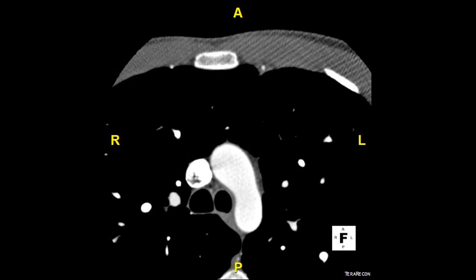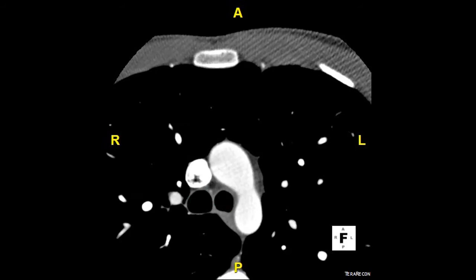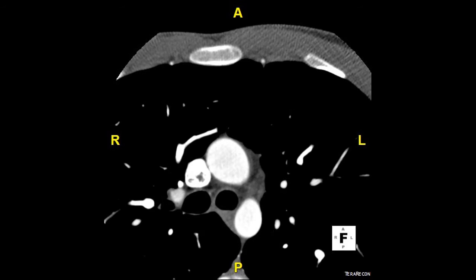I quickly want to mention that you can see the trachea has now divided into the two primary bronchi. I'll just circle those very quickly here in green. The aortic arch has now separated into two different structures. These are the ascending, which I'll circle right here in red, and the descending, which I'll circle right here in purple, portions of the aorta. The superior vena cava, as you can see, hasn't changed, and let me outline that in blue for you right now.